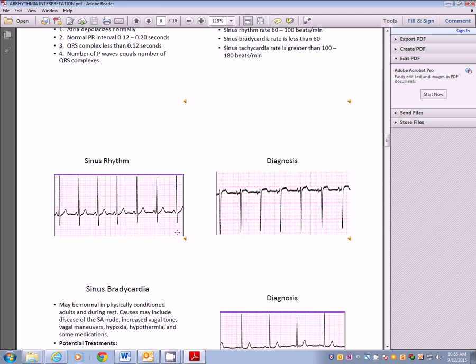All right, now I'll show you this other one just to show you that, again, remember what I said earlier. You may be looking at it in different leads so that your QRS complex looks upside down. Everyone's QRS may look a little bit different like we talked about earlier. But if you look at this one, you've got your P waves, you've got your QRST, it's just upside down. P, QRST, P. So this is a typical normal sinus rhythm as well.